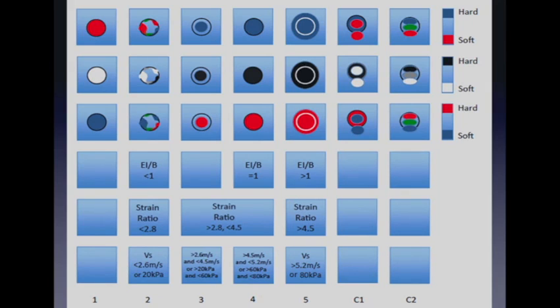Because if you use the black and white scale and you have the B-mode image in black and white and the elastography superimposed on it, you really can't interpret those images because you have a grayscale on grayscale image, and you really have a hard time distinguishing the 2 images. So all the manufacturers except one will allow you to completely eliminate the B-mode image from the elastogram. So in all the images I showed you, the image of the B-mode is by itself and the image of the elastogram is by itself. But I've color-coded these based on kind of a BI-RADS score going from 1 to 5.